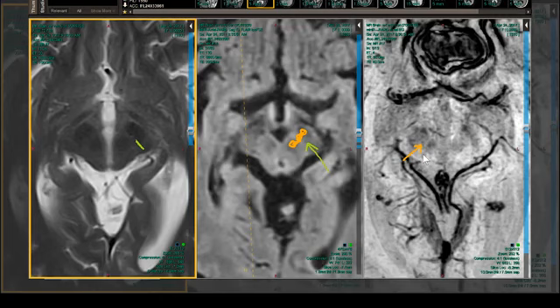But in amyloid, you don't get bleeds in the brainstem. In hypertension, you get bleeds in the brainstem. Now, hypertension is also a cause of multiple hemorrhages, but they usually don't end up as these punctate subcortical hemorrhages, and then all of a sudden you see a lobar hemorrhage in the cortex. That is very typical of amyloid, whereas hypertension, brainstem, basal ganglia, where you have small vessels, usually lenticulostriates, thalamostriates, is where the hypertensive hemorrhages occur.